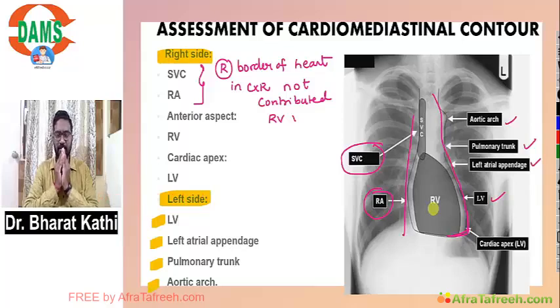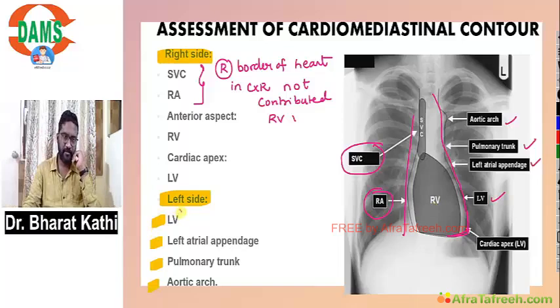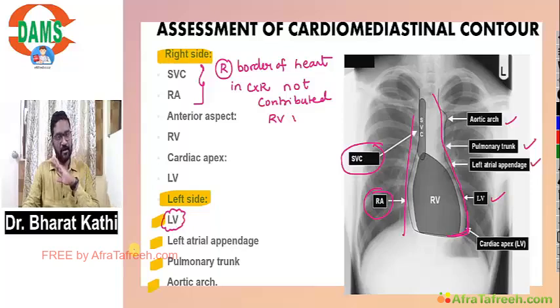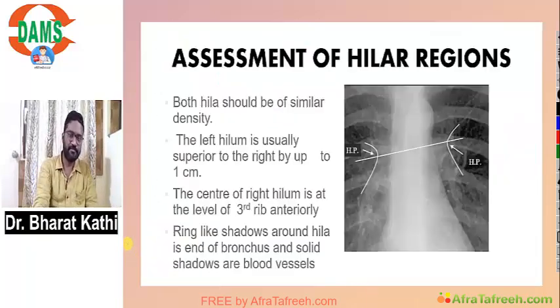The right ventricle is not a part of the right heart border, whereas the left ventricle is the prominent part of the left heart border.